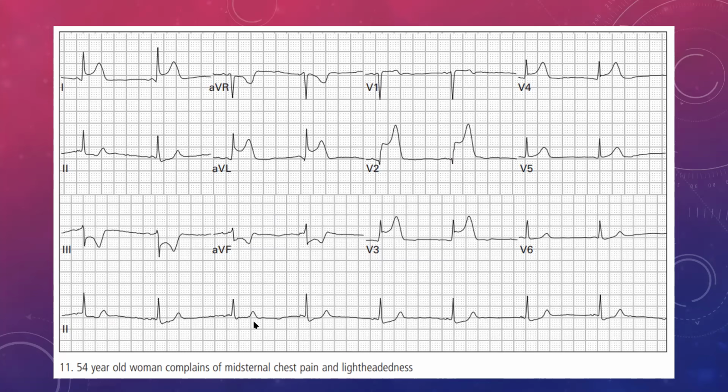Okay. Let's see if we can have a look at our rhythm. So even though we can see there's a lot of ST elevations, that is there. We're not denying that. We're just going through it step by step because this is the habit that you need to get into so that you know how to manage your patient because there may be multiple pathologies in a single patient. Okay. All right.